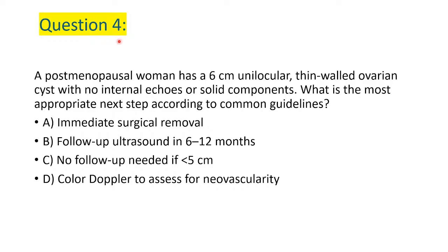Question number 4. A post-menopausal woman has a 6 centimeter unilocular, thin-walled ovarian cyst with no internal echoes or solid components.